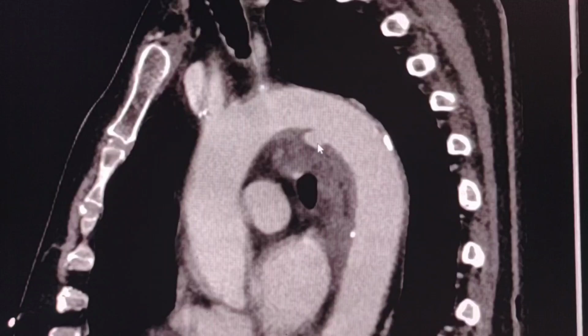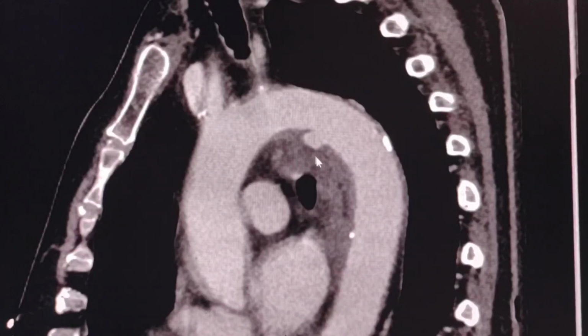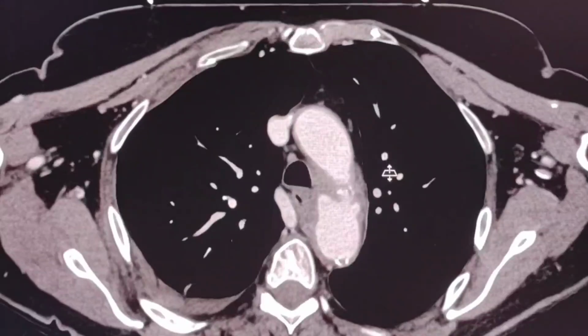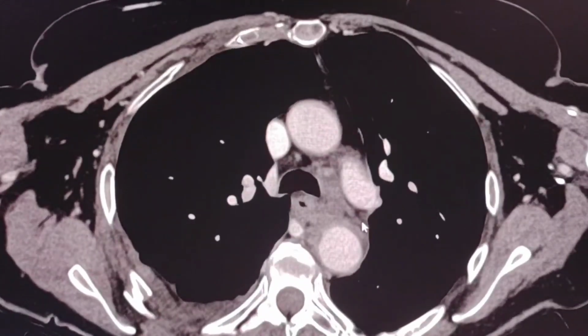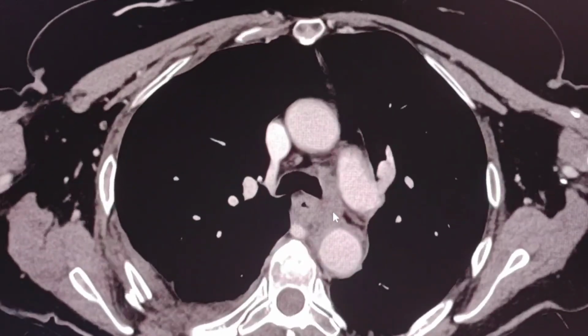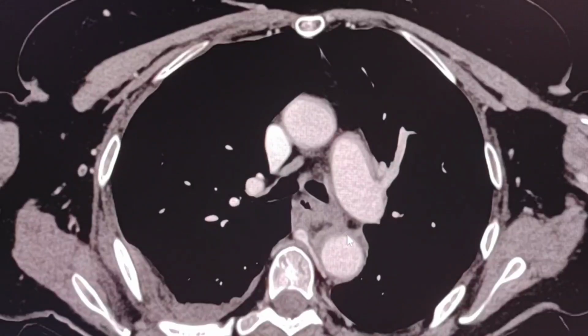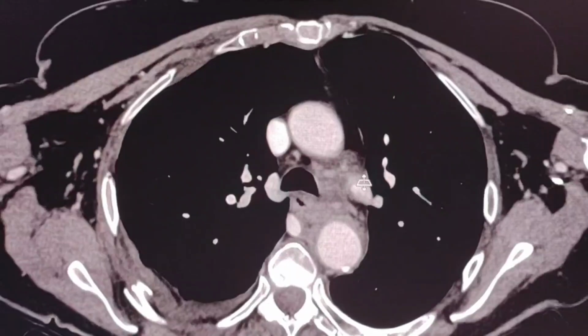So what we see here is a pseudoaneurysm, and additionally there is some haziness around the vessel, around the aortic arch here. Let's have a look again in axial views, and all this haziness around the aortic arch, which is extended downwards along the descending aorta, is abnormal. Actually, it's hemorrhage.